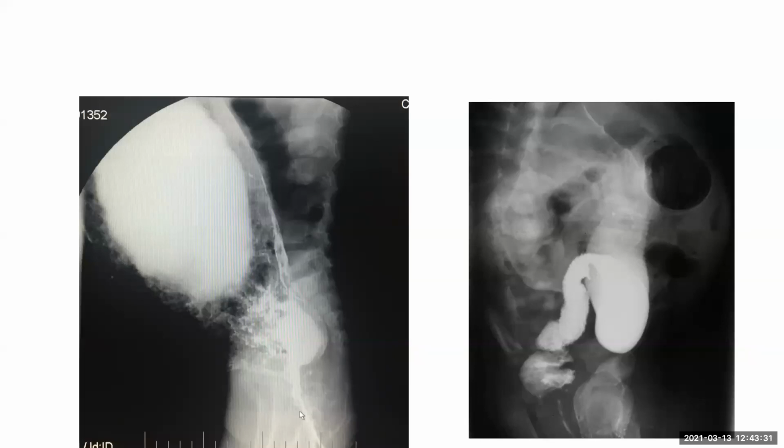And when the child is small, we don't see such big dilatations, when the child presents with severe constipation after birth and we can't see the narrow segment, then we do the 24 hours film to confirm our findings, and then we tell the clinician that there is retention of barium and he should go for the biopsy. Okay, madam.